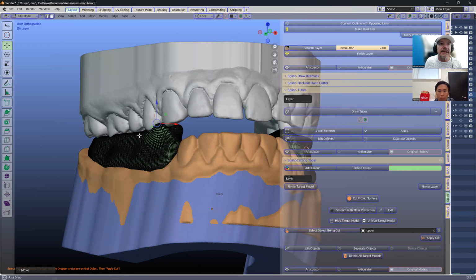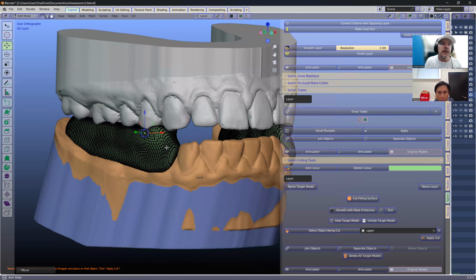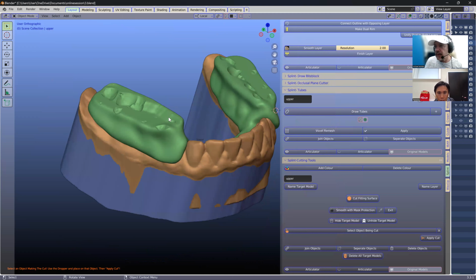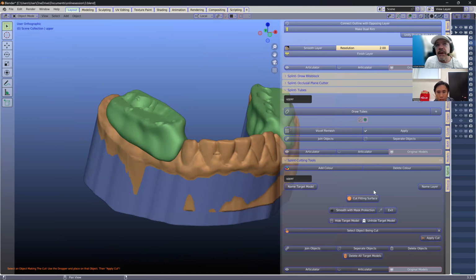We are very flexible in what we are doing here. As soon as you go out of edit mode, it's going to recalculate and we've got the cut. Just keep that in mind, provided this Boolean is on.